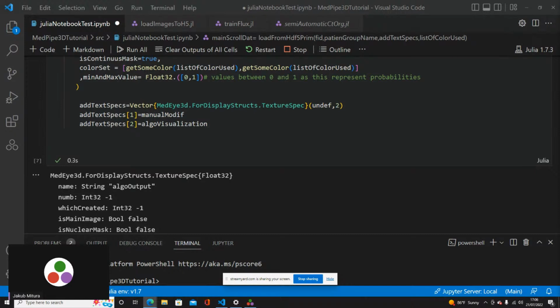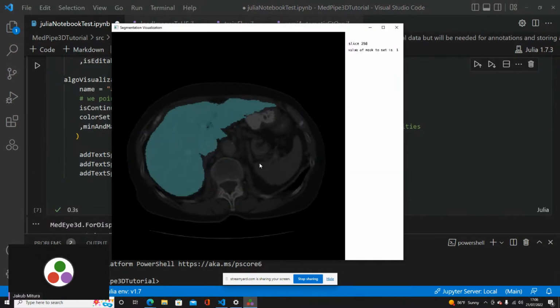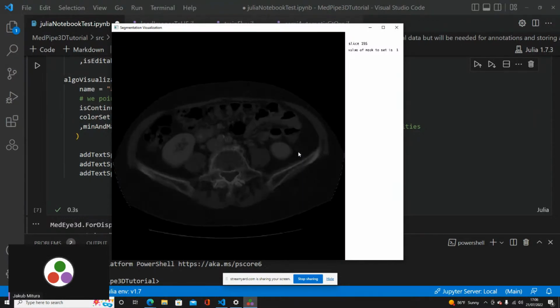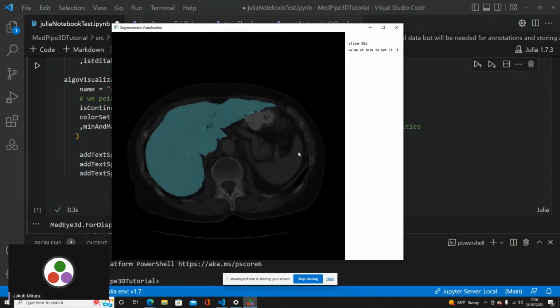Okay, so I'm back. I hope that there are no problems now. We'll delve into how to use the visualization. First of all, you scroll using the scroll wheel on the mouse, so you go up, down, up, down. This is 3D medical data.